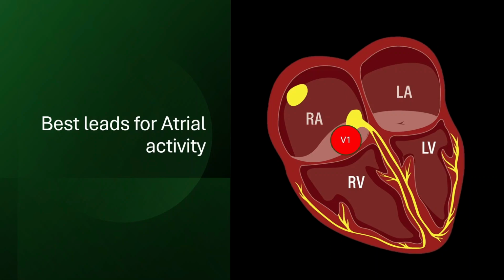One last tidbit is that atrial flutter can actually be irregular or regular, so be careful when reading the doc in the box, as it might call atrial flutter actually AFib.